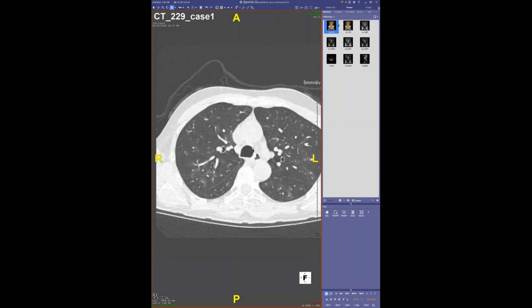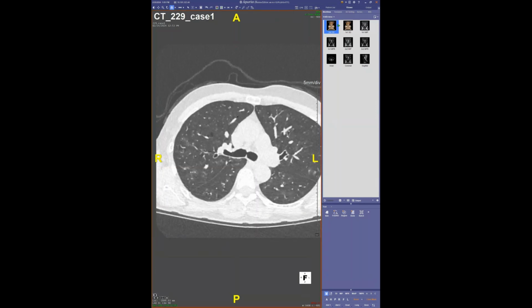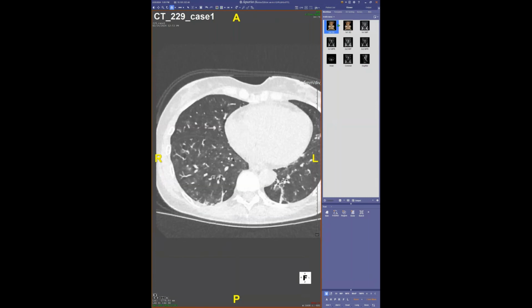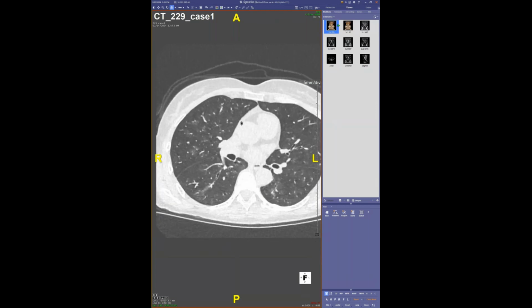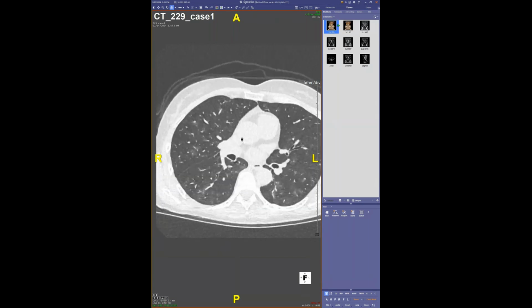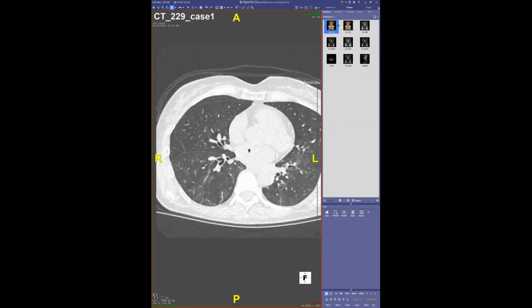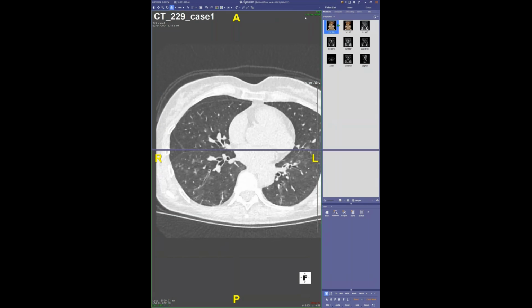Getting back to work today is always a little difficult. But yes, this is not in the setting of acute hemoptysis or anything. This is just with active disease. No hemoptysis. This imaging appearance has been going on and getting worse for about 4 or 5 years. If you remember, I don't have them with me, but the cases I showed from UCSD, over time these airways would get really bronchiectatic, which is a common progression with them.